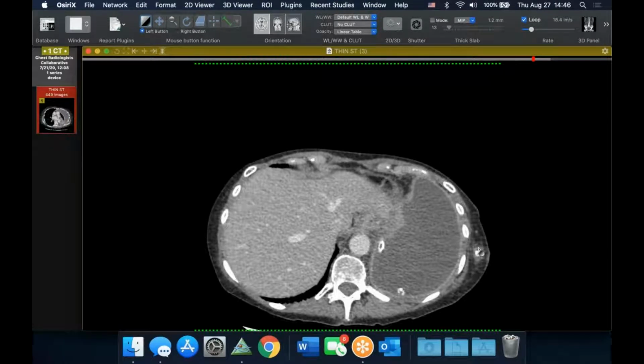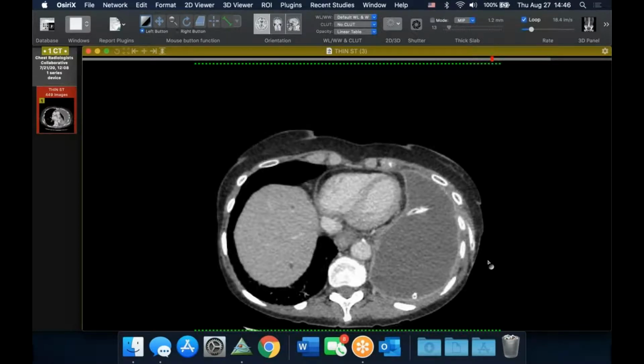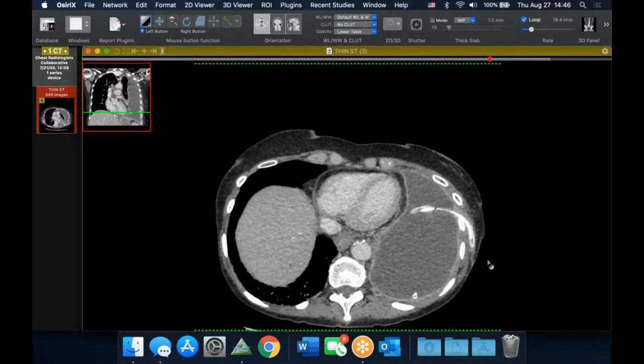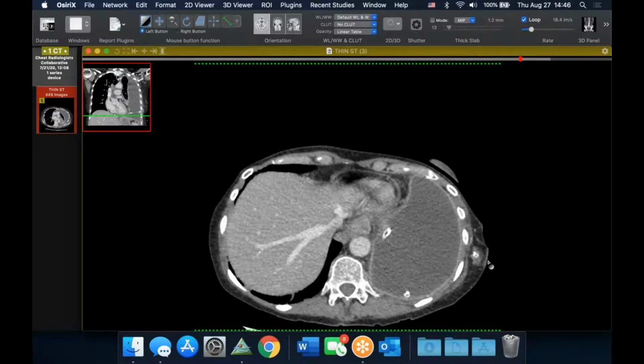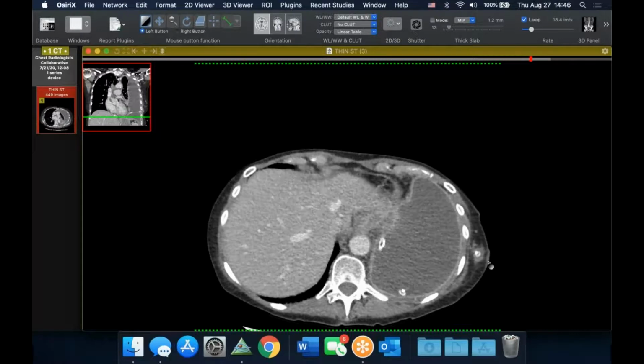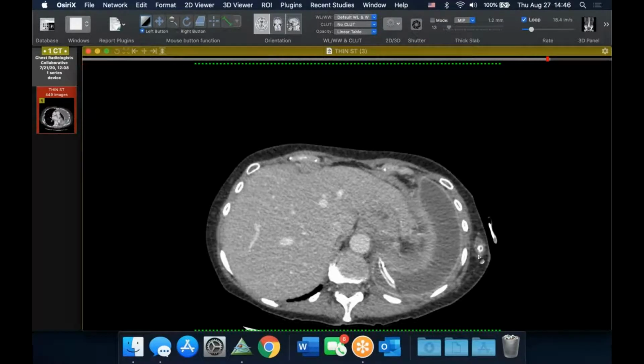And what's kind of cool is if you look in the chest wall where the Pleurx is, you'll see there's actually fluid tracking around the drain. And we usually don't see that with these Pleurx. Often we don't even get a CT. They're often just followed with radiographs. But the interventional pulmonologists were concerned that the entrance site looked angry, and there was some pus in there as well, that this was infected.